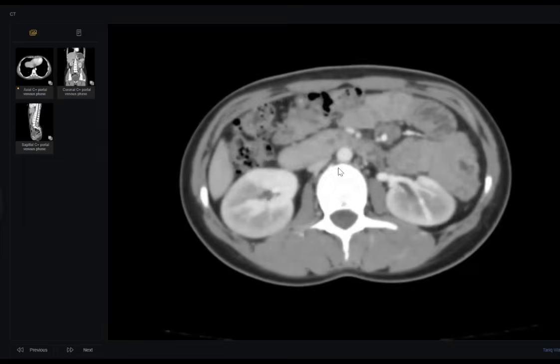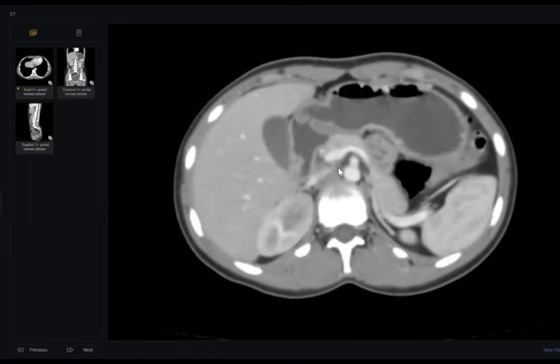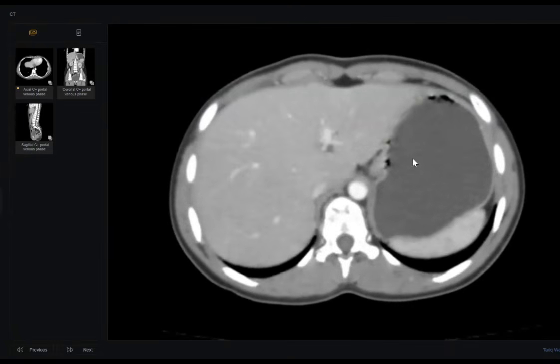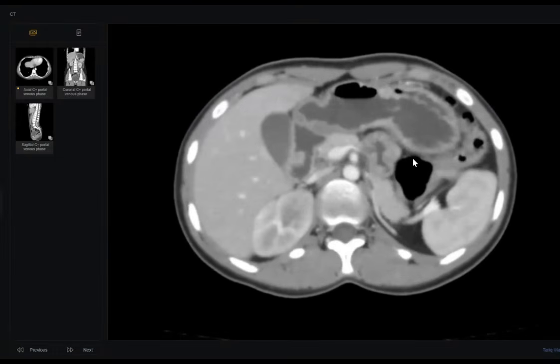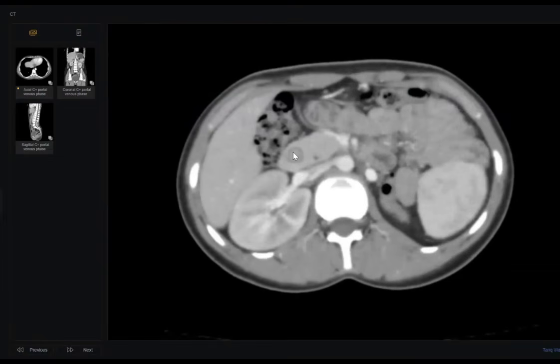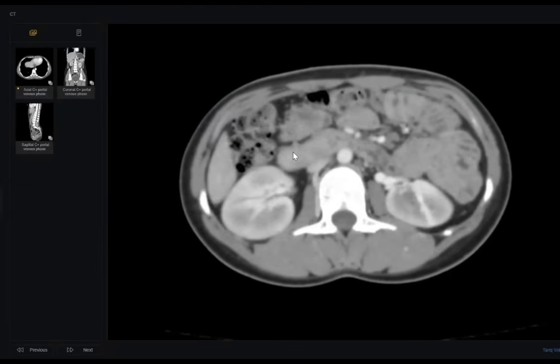Okay. Thank you, doctor. You did very well. It is also an observational film. Why? Because, see here, this is not an easy case during the stressful viva exam. Our colleague did very well. When she saw dilatation of the stomach and duodenum, she followed her doubt. Radiology is 50% of your diagnosis, sometimes following your doubt. She found something abnormal. At first she was confused, but she corrected her situation.